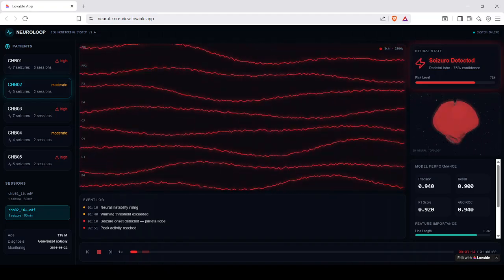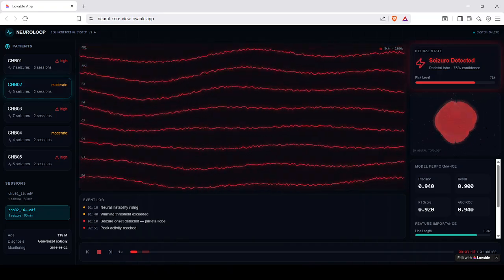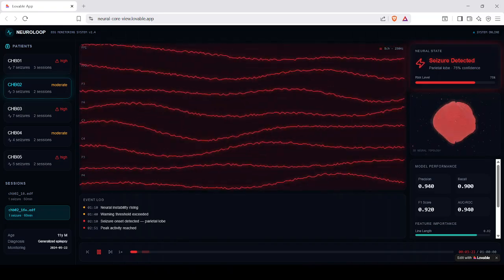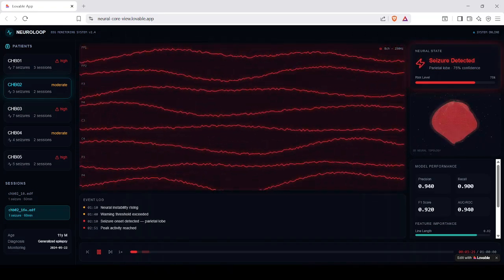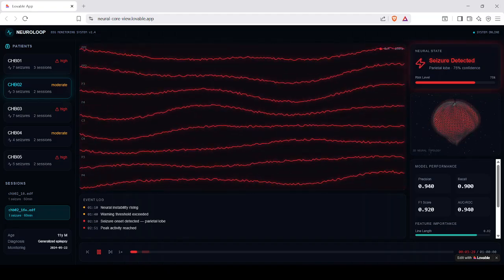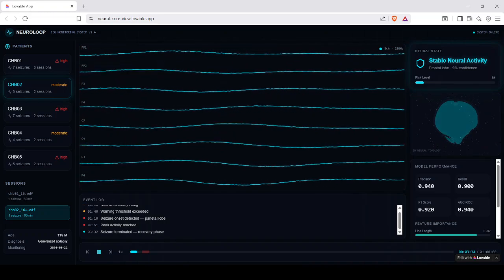Neural hotspots pulse in amber red. Particles spark around active regions. The surface glows with intensity, depending on signal severity. Instead of reading where activity occurs, you can actually see it happening. It turns invisible neural events into something physical and explorable.